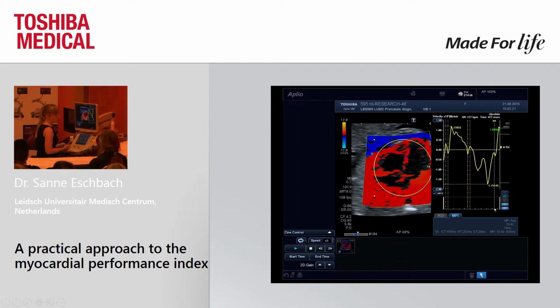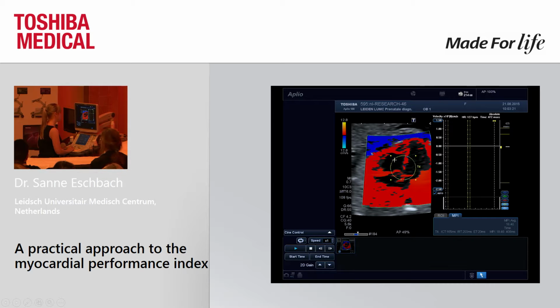So this is in the global heart, and our experience is that the global heart is the easiest part, because it's not difficult to define your region, because it's the whole heart, and the image is very clear. It's more difficult when you want to look at smaller parts of the myocardial wall. So let's try it on this one. We make the region of interest somewhat smaller, and then we can say, for example, we were here in the septum, and let's move this away. Yeah, that's better.